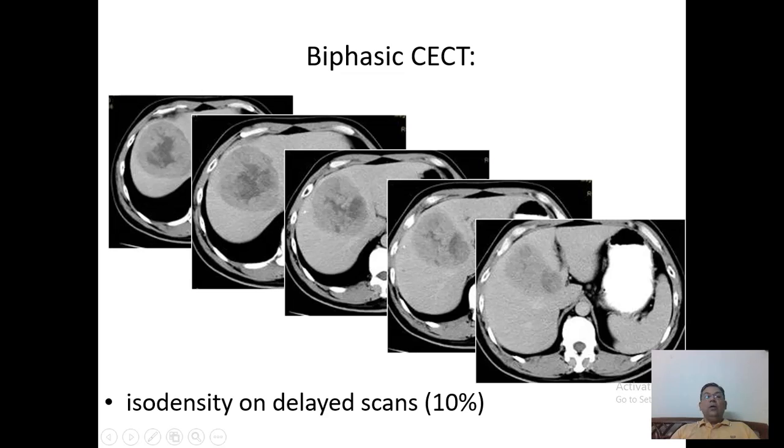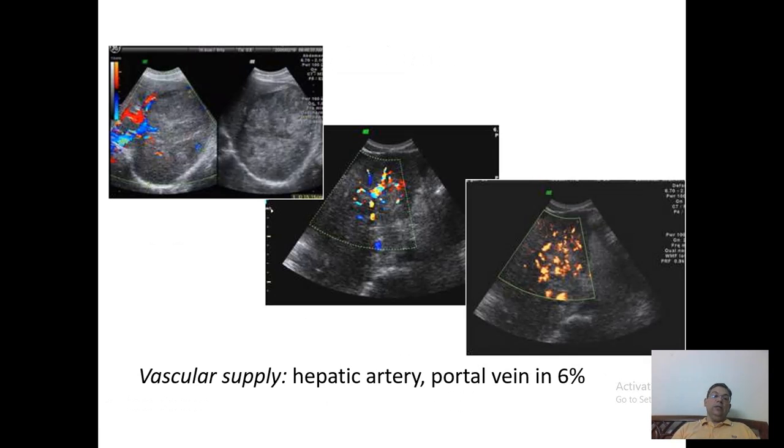सो इस सारे को जानने का हमें फ़ायदा क्या, हमने इमेजिंग कर ली, हमें आइडेंटिफाई हो गया. ये देख करेक्टरिस्टिक है कि ये हेपेटोसेलुलर कार्सिनोमा है, और ट्रेडिशनली सॉलिड ऑर्गन ट्यूमर्स में हम नीडल बायोप्सीज को अवॉइड करते हैं, लिवर के अंदर करते हैं ताकि वो ब्लीडिंग वगैरह ना हो. और ये सीटी स्कैन तकरीबन डायग्नोस्टिक है ऑफ दिस काइंड ऑफ लीजन. और इसको हम इस्तेमाल कैसे करते हैं ट्रीटमेंट के लिए, अभी इसके बारे में भी हम बात करेंगे.